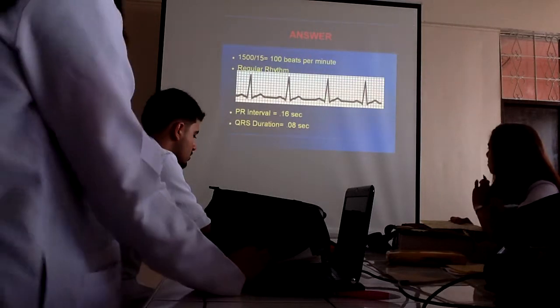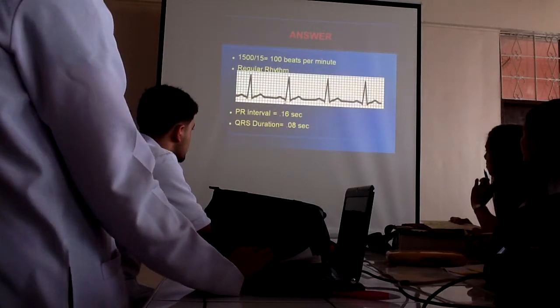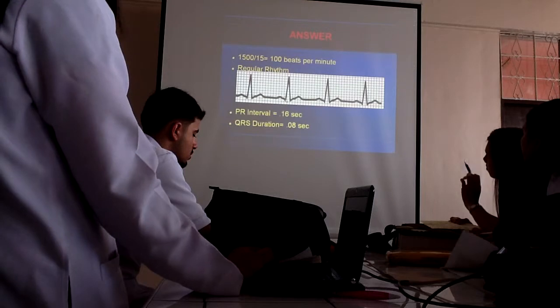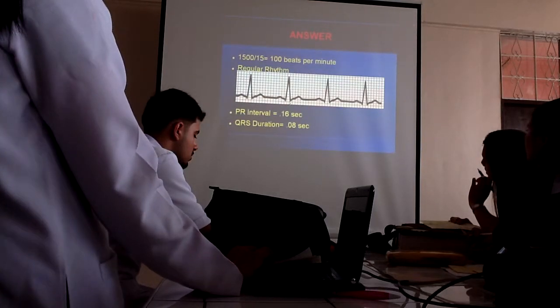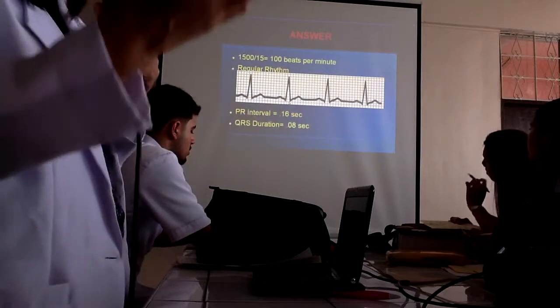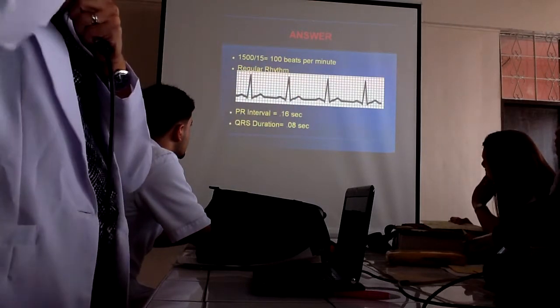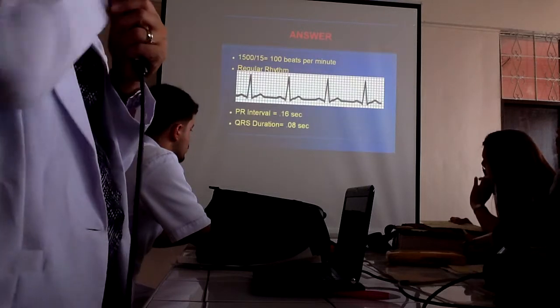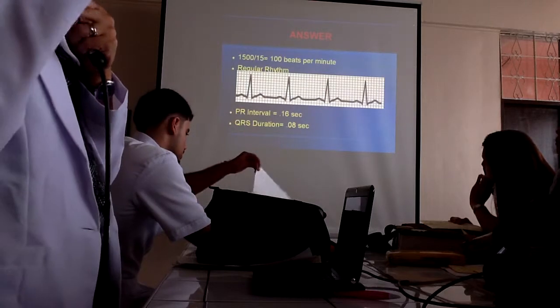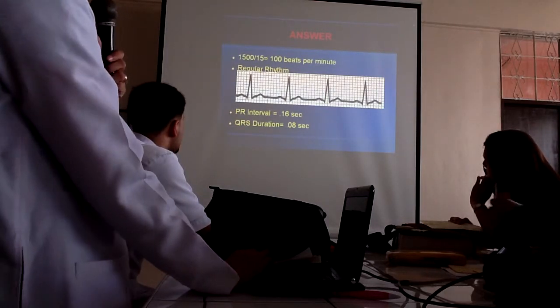Okay? 0.04. 2 squares mo yan. That's basically 2 squares because this one is half of that square and half of this square. And this one is one entire square. So 0.08. Okay, so that's normal. Because it does not occupy the beginning of the square. You estimate it as part of 2 squares. Okay? So the answer is 0.08 seconds.